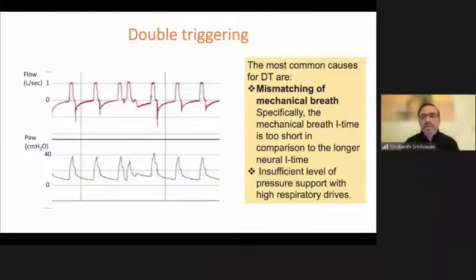Now coming to what's called double triggering. Now double triggering, you can see on the waveform here, normal breath, suddenly 2 breaths together. Again, normal flow, normal flow, normal flow. Same on the pressure waveform. This is a pressure scalar of a volume mode, and you can suddenly see 2 stacked together. Now, this is a rather common phenomenon. The problem, obviously, is pretty obvious what's happening here. We are giving double breaths.